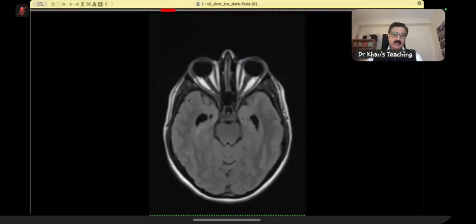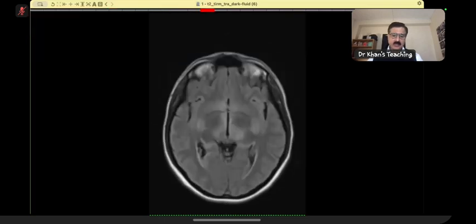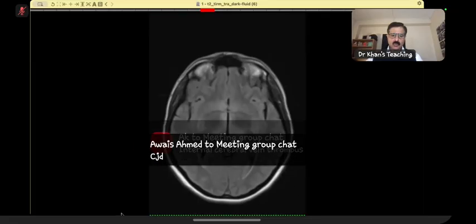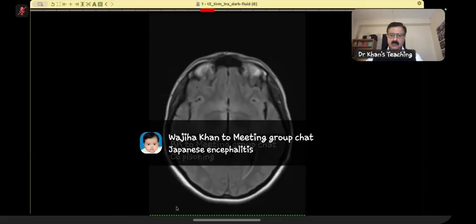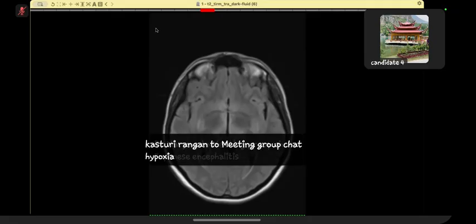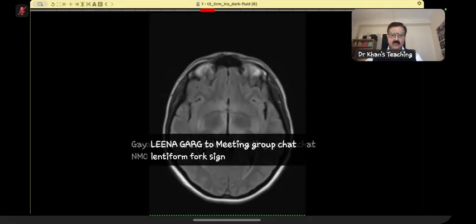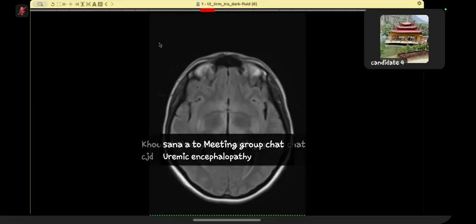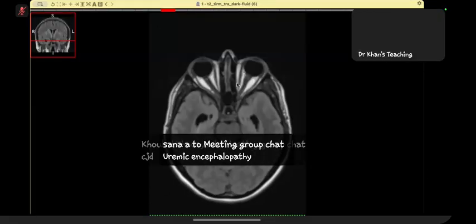So this case is for chat. Question for chat. Anybody got it? Give me your answers in the chat. Anybody? My chat is not working actually. What have they given as the answer? Sir, lentiform fork sign, uremic encephalopathy, CJD, Japanese encephalitis, NMO.